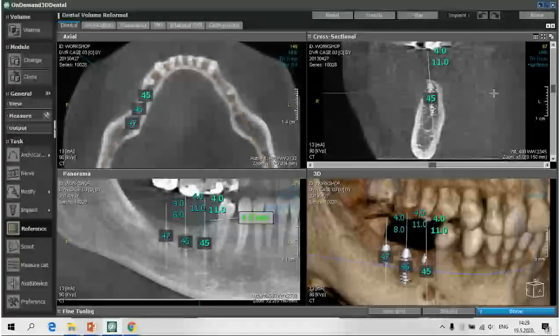So in Serbia, mainly radiological technicians do this kind of recognition after the acquisition phase of the CBCT volume. But although they do their job well in 95-98% of cases, we could have some specific situations where we have double mental foramen endings, even a double canal, wide canals, or situations where canal recognition is really difficult.